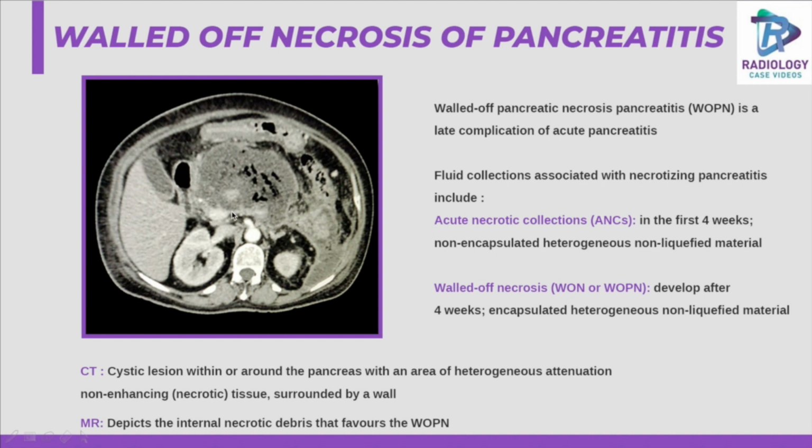The possibility of pseudoaneurysms within these walled-off necrosis has to be ruled out. MRI depicts the internal necrotic debris that favors the walled-off necrosis. And the differential diagnosis can be pancreatic pseudocyst and pancreatic neoplasms.